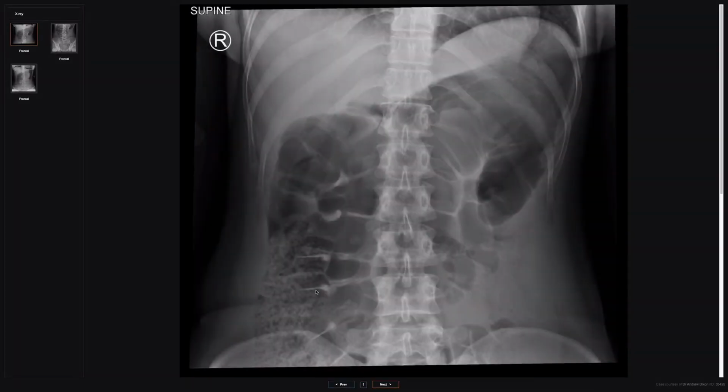So let's move on to actual abdominal radiographs, proper abdominal radiographs. It's very hard to find a good example of an abdominal radiograph where there is some subtle pneumoperitoneum. We don't really have many of them. So the ones that I'm going to show you are really glaringly obvious examples. And if I ever find myself questioning, oh, is there or isn't there pneumoperitoneum, honestly, just stop and get a CT. That's the best thing to do. But anyway, here is what we do see.